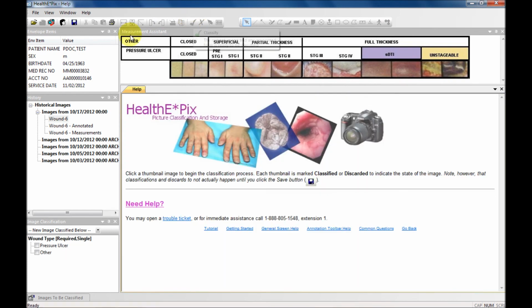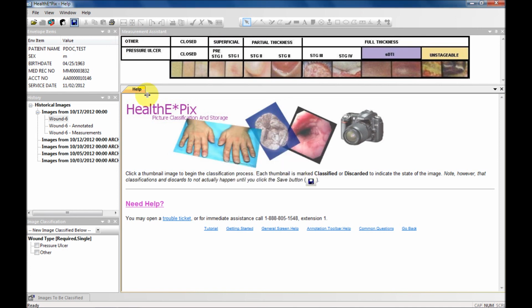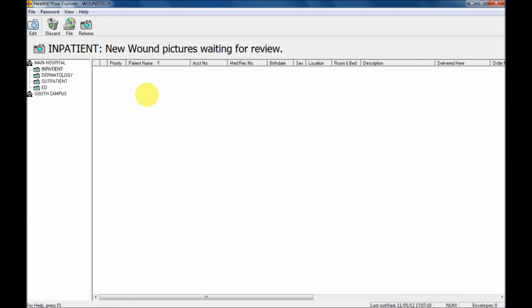The system can now perform additional background processing on the work we just finished, producing reports with embedded pictures and progress graphs, sending results to other applications via HL7 and EDI, or even creating a new envelope with specified contents to be assessed by a WOCN or doctor for further review, report edits, and signature.